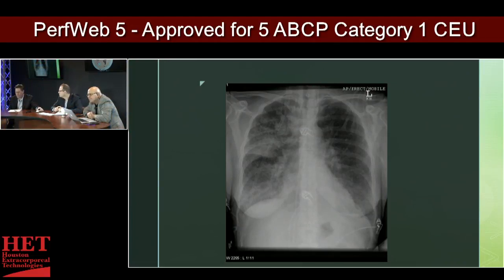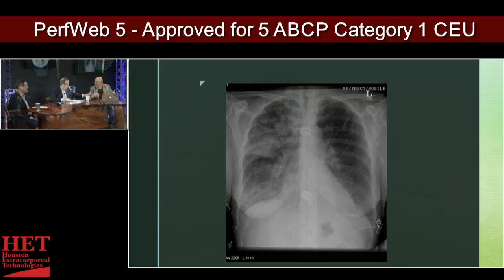Well, then I'm curious about this little section right here. Let's focus on it. You want to start with the left? Okay. Can I have my part answered? Yeah. All right, Joe, I'm getting sensitive here. You got the baton. Run. No, I'm waiting for you. Are you ready to get the right lung? Okay, yeah. I thought you were going to say something profound, and you're forming the words. No, I don't need to say anything else and show how little I know about this.